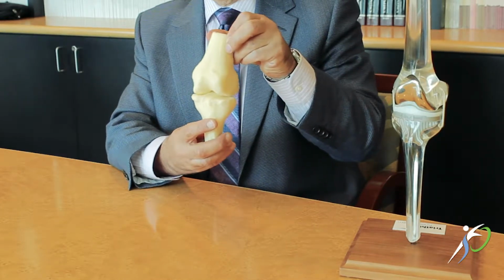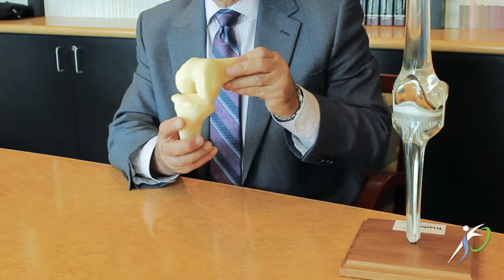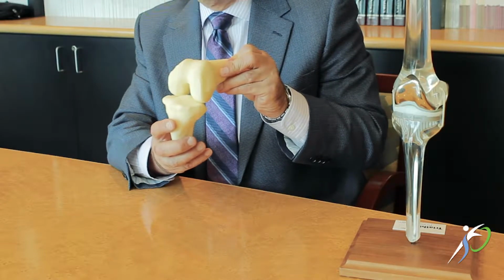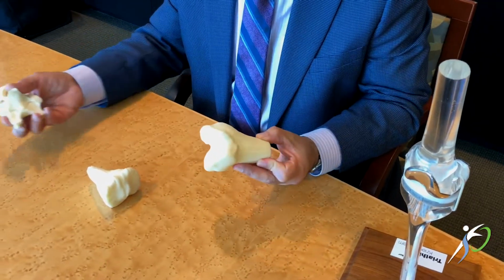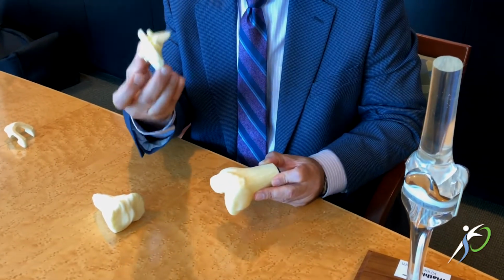This is all done on a computer, and what we do is we then place the implants precisely the way we want them to be at the time of the end of the surgery. And what the computer can then do is generate a 3D printer model of what we call a cutting block.